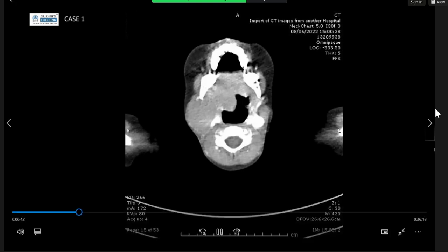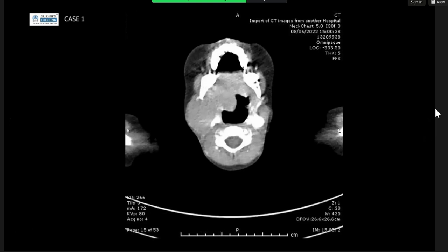There's some non-specific symptoms, but all the other differentials are, as you said, within reason. The only thing here is that I don't think it's as vascular as what I like the others to be, and this is quite homogeneous. And then the other thing I'll be thinking of is the head and neck.